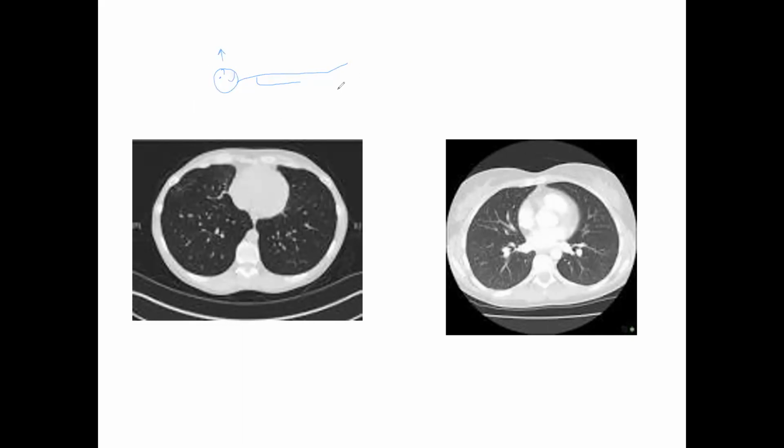Then your orientation basically is going to be standing at their feet, viewing them from the feet to the head.